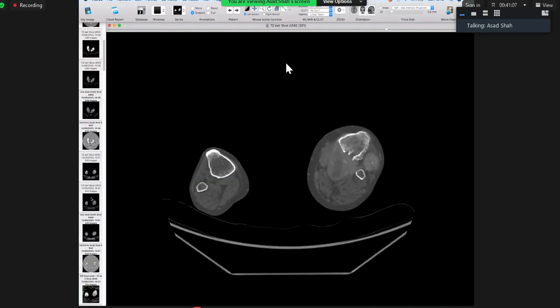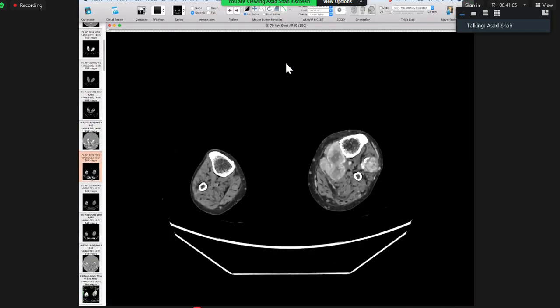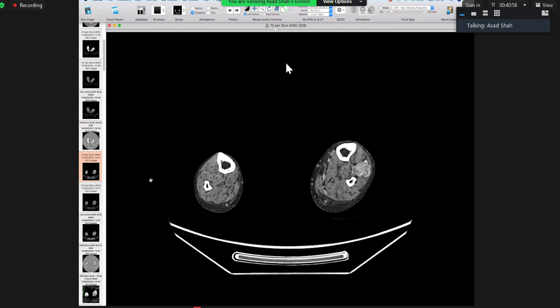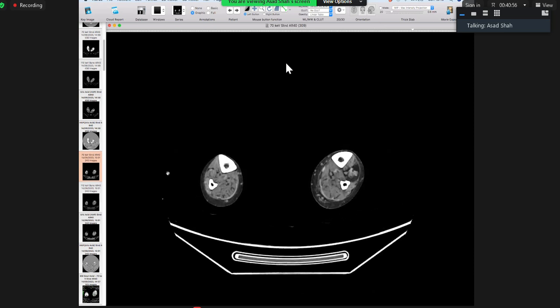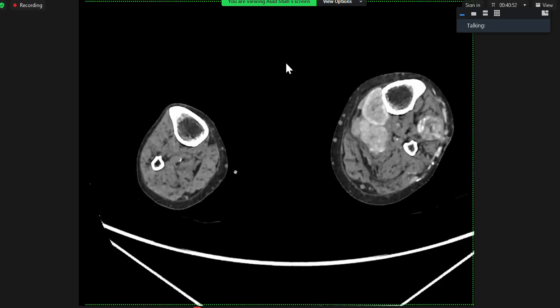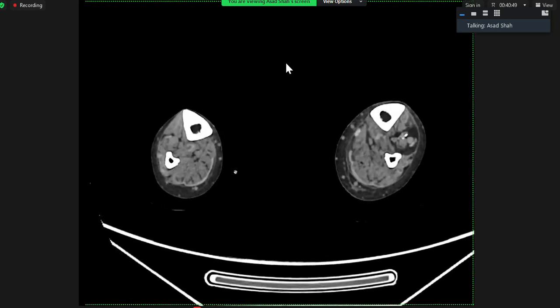And then somehow we did the ankles as well, actually. So I'm just going to show you the ankles now. So if I go down, we're going down, all right? Okay. I keep on jumping, but let's see. I hope we get to the ankle.